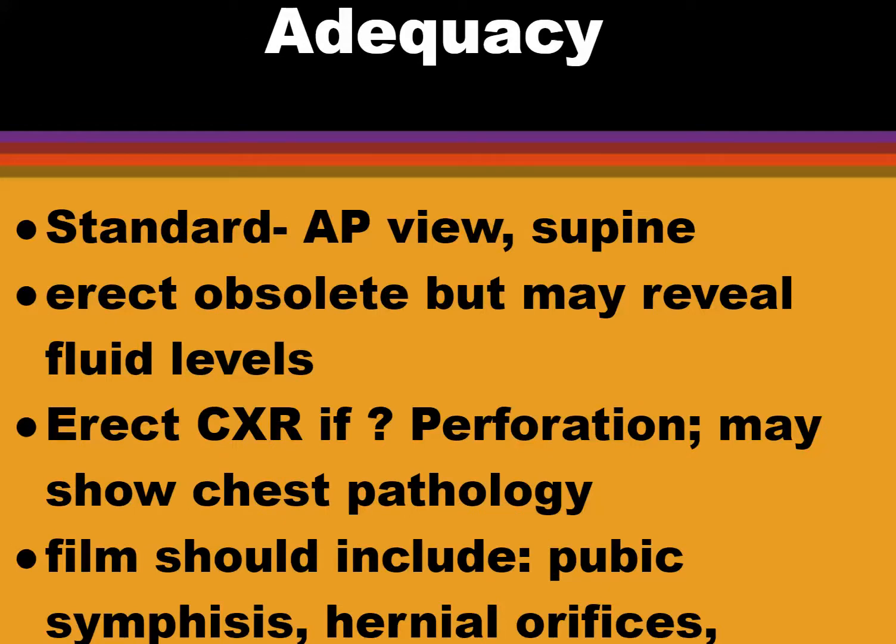Look at the film. See whether it's a standard AP view or a supine view. We don't really do erect abdominal X-rays anymore, but they did have a use when you were looking for fluid levels within bowel, which is a sign of obstruction.